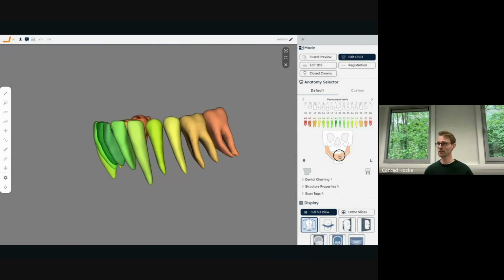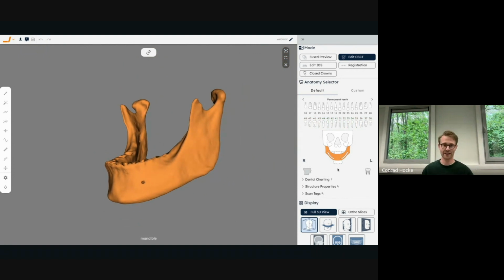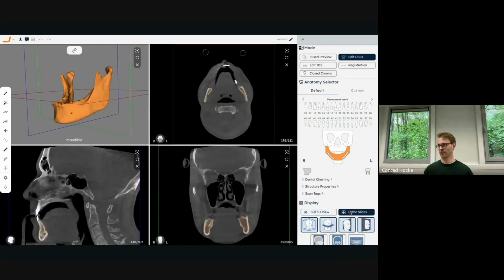In Edit CBCT mode, you also get access to our manual segmentation tools. If those are of interest to you, we have created a series of YouTube tutorials that really go in depth on those features. If you want to learn more, I highly recommend you to watch them. Then let's go right to the next chapter.